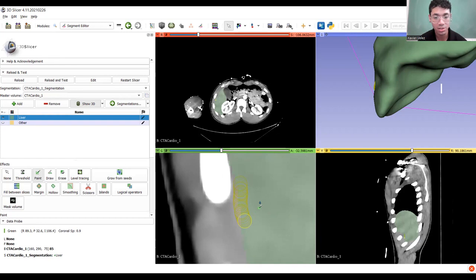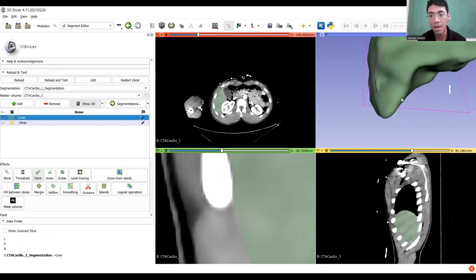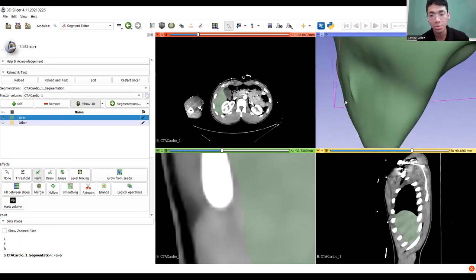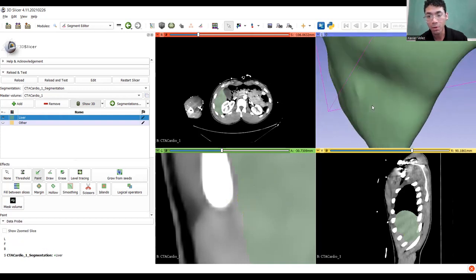And this part is pretty tedious, which is why I'm not going to spend too much time on it today, because it would just be me manually going through this, like, look, I'm drawing, and that kind of sucks. You can see it's starting to fill in. It's looking like I might be going a little too crazy on it, so I'm going to dial it back a little bit. Let me undo some of what I'm doing, and I'm just going to go pretty close to this edge right here. Okay, so I'm just going to keep going. I'm just going to chug through.